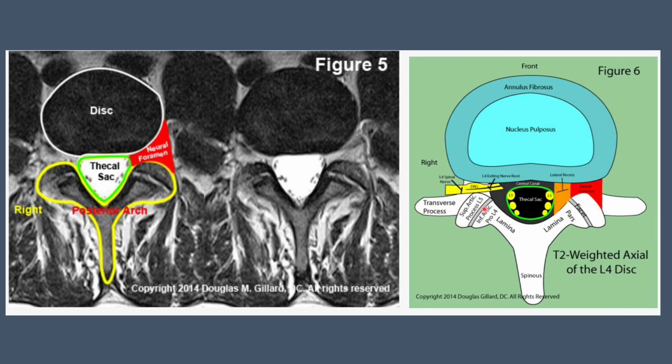And when you look at the facet joint at this particular section, it is like a hamburger. So this aspect of the hamburger is actually the SAP, or the superior articular process. And behind is your inferior articular process. And here you can see the lateral recess and your neural foramen. So you can see the central canal. If there is a compromise here, it is a central canal stenosis. If you're compromising here, that is your lateral recess stenosis, and here would be your foraminal stenosis.